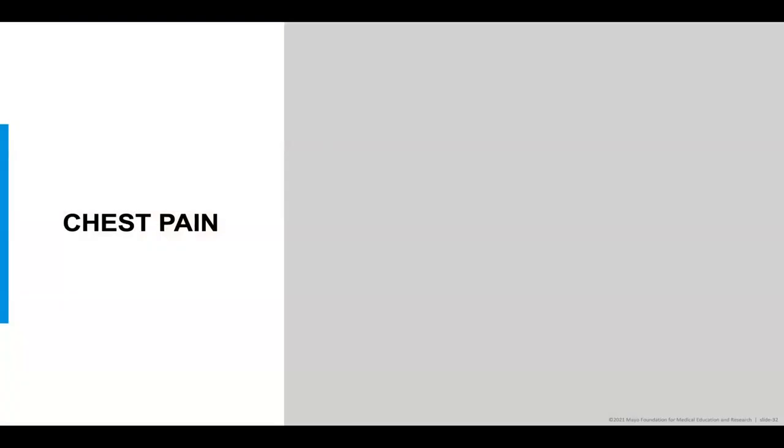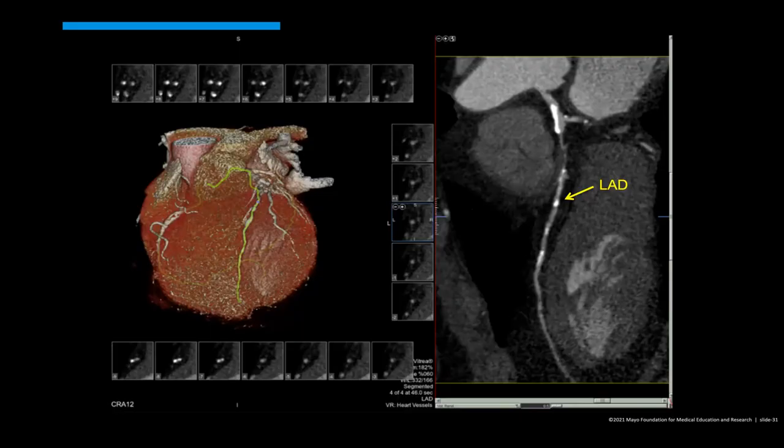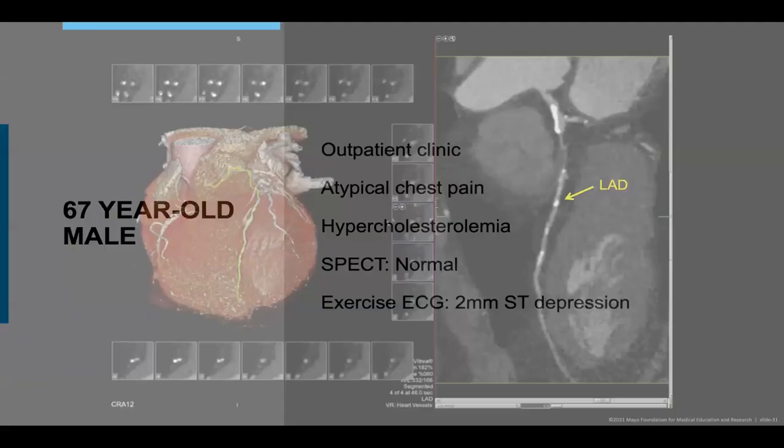Thank you. I'm sorry, I had one more question that came up. Can you point out the very last stenosis that was shown on the previous case? It appears very subtle.